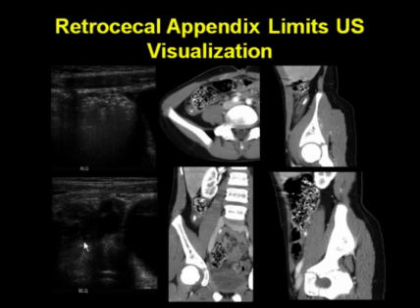So this patient did go on to have a CT scan, which unequivocally demonstrated abnormalities consistent with acute appendicitis. So here we see a retrocecal appendix. It is thick-walled. There's some enhancement of its wall. There's a little bit of stranding of the surrounding fat. And here we can actually see that there's more than one stone. There's several tiny stones there.